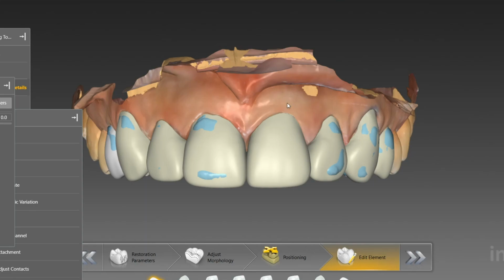The doctor's intention, CEREC user by the way, was to get a diagnostic wax-up done and then biocopy that diagnostic wax-up. So get the wax-up done, have the patient come in, do the preps, and then after the preps are done, scan the wax-up in the biocopy folder, hope, fingers crossed, that those two scans stitch, and if they don't, you have to manually correlate. So what we're hoping for is just a good stitch.